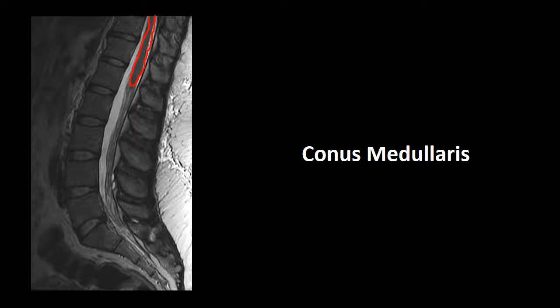Now think about what vertebral level the conus medullaris ends at. And if you can't remember from your lecture classes, just apply what we talked about in the last slide to this diagram. We'll label the lumbar vertebra, starting with identifying our landmark, and then move up the spine. So our landmark was the first sacral vertebra, which I'll just label again, S1. And then I'll quickly label our lumbar vertebra. We'll just say 5, 4, 3, 2, and 1.